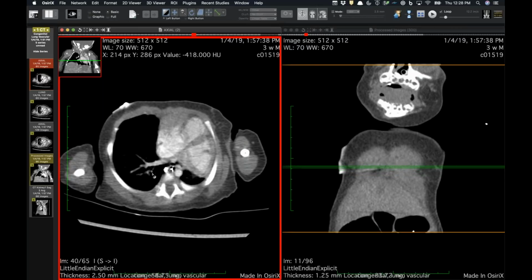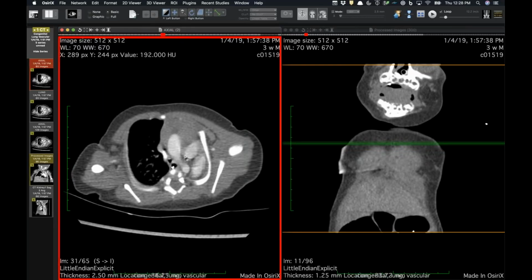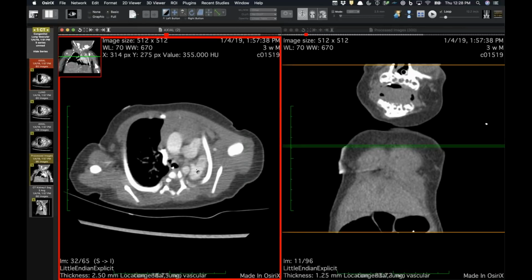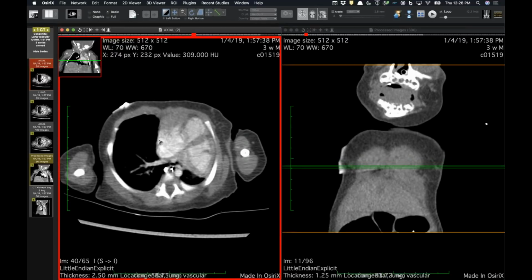Travis, can you show the vasculature? I agree there's no bronchus. I was just going so fast I couldn't quite follow. Yeah, they're thick slices too, but you can see that's just the main pulmonary artery, and there's nothing on the left there. You're right. And there's no scimitar.